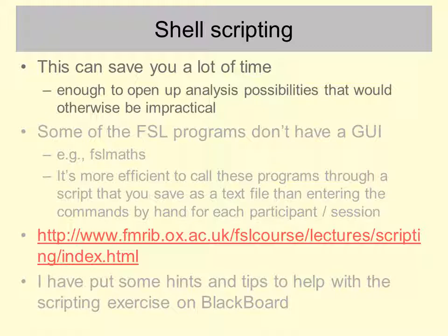Shell scripting is something that can save you a lot of time if you're prepared to put in the initial effort to learn how to do it. As well as saving you time, it gets you into using those parts of the FSL software that are only available via the command line. So, for example, FSLMaths is a really useful program, but it doesn't have a graphical user interface.